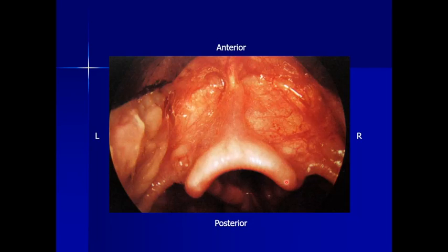It's important to look at the adjacent anatomy that's not part of the larynx because it plays a role in tumor spread. So here's your epiglottis, here's your AE folds. The ventral surface of the epiglottis is not part of the larynx, only the dorsal aspect. So ventral to, or anterior to, the epiglottis is the vallecula, and anterior and superior to that is the base of tongue. You have the soft tissue that goes from the pharyngeal wall to the epiglottis, the pharyngoepiglottic fold, that acts as a vehicle for, or a route for, tumor spread. And more cephalad, you can see the palatine tonsil.